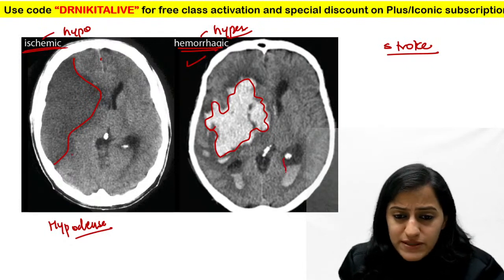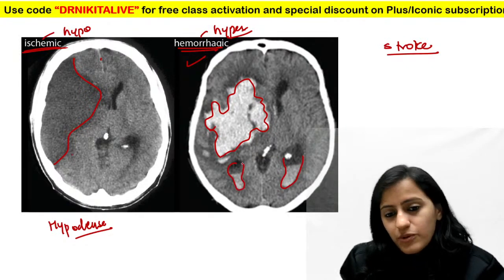And here if you see, what do we see here? What is this part of the image showing? What is this, anyone?